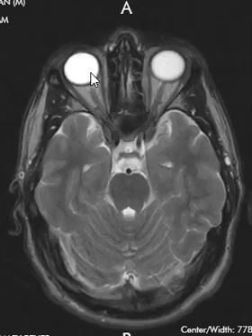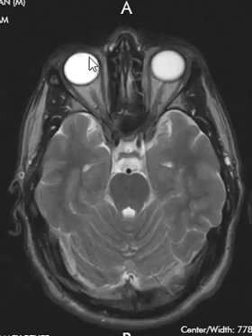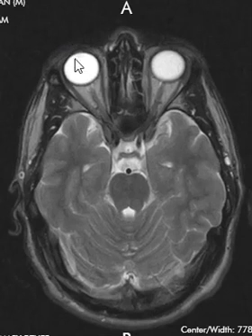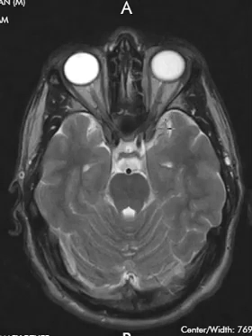We see the right eye, left eye. Look at the lenses. We make sure the eyes are normal in contour. Make sure they're not poking out, which we call proptosis. And we see these linear bands coming off the back of the eye. These are the optic nerves. So we look carefully at those to make sure that the optic nerves are normal in appearance, and they are. And we look at all the fat, which is in the orbit here. Right and left side, the fat looks preserved and nice.